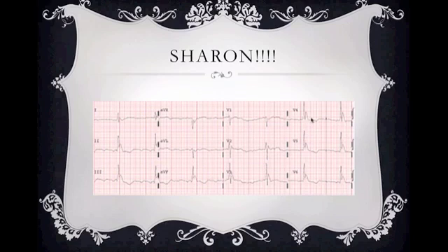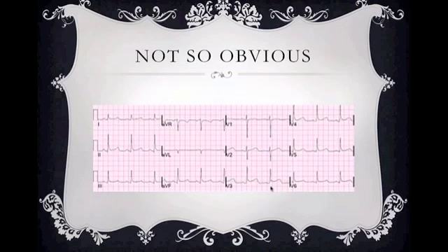Almost looks like my T wave is smashing into my R wave here. That is an Osborn wave. Osborn wave. We can see it all throughout the EKG. All right. So that could cause some ST segment elevation as your Osborn wave smashes up against that R wave. Right? But then again, we also might not see it too obvious.